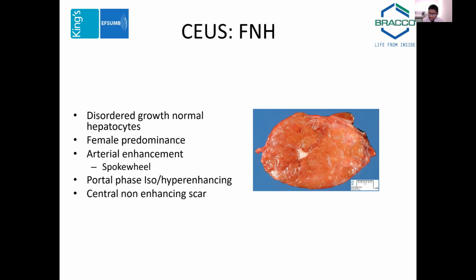It doesn't wash out. It either stays iso or hyper-enhancing. It may show a central scar. And there's a subtle difference there between the star of the filling vessel and the scar, which is the central fibrotic area. Now, in an MRI, the contrast is different. So it then enhances late that central fibrotic area, as opposed to contrast enhanced ultrasound, where the central scar does not enhance because it is not vascular.